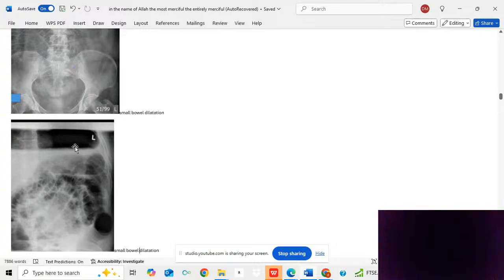Another example of a small bowel dilatation. As you can see here, valvulae conniventes, which traverse the whole lumen, okay? The bowel loops tend to be centrally located, and while traversing the spine, they tend to not spare the lower 2 lumbar vertebrae, as you can see here.